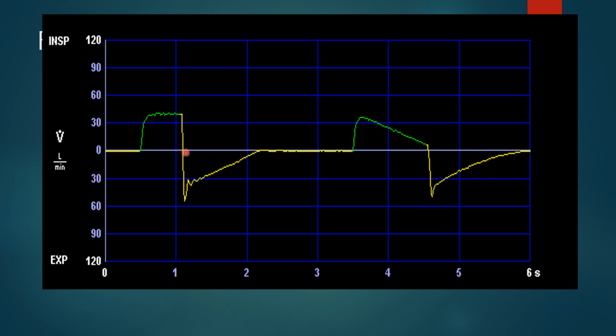And then the patient exhales. This breath is going to last longer if the peak flow is set the same and the tidal volume is the same, because this flow is only at the very beginning of inspiration, but as the breath is delivered, the flow slows down until it gets to almost zero, and then the patient is allowed to exhale.